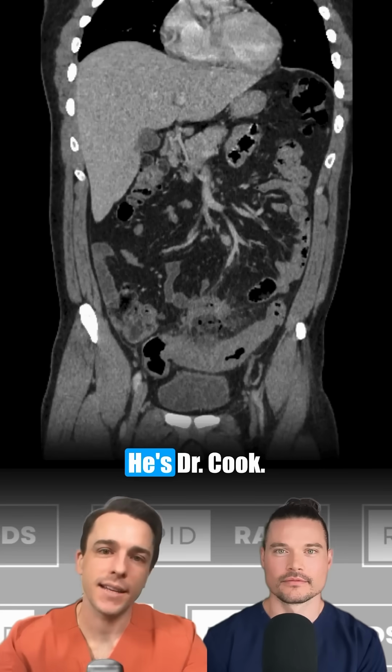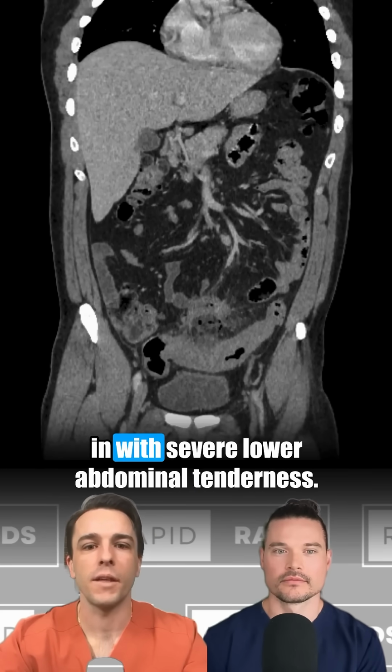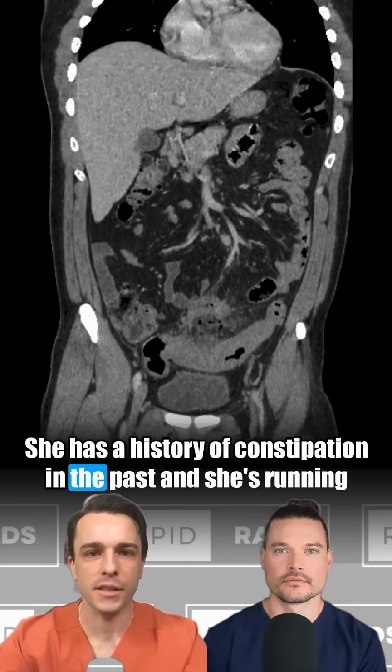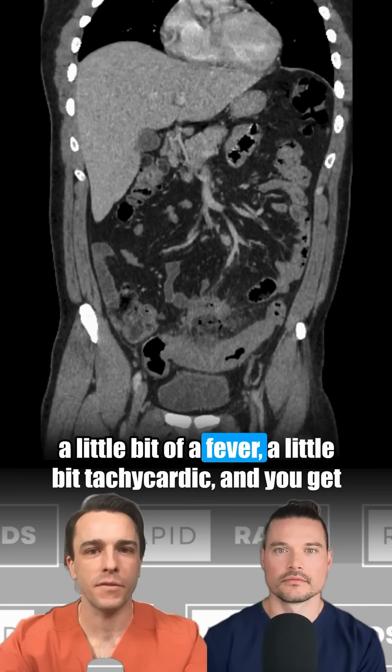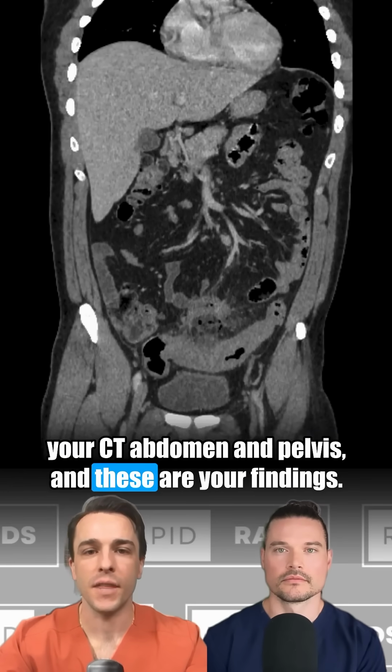I'm Dr. Riley, he's Dr. Cook, and this is a case of a 45-year-old female coming in with severe lower abdominal tenderness. She has a history of constipation in the past, and she's running a little bit of a fever, a little bit tachycardic, and you get your CT abdomen and pelvis, and these are your findings.